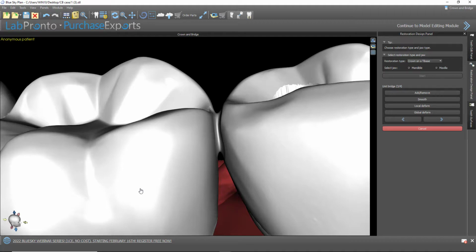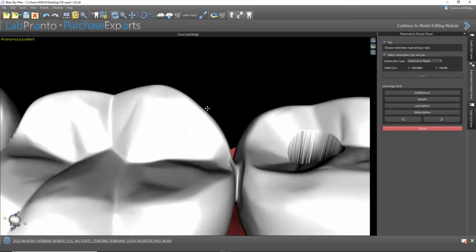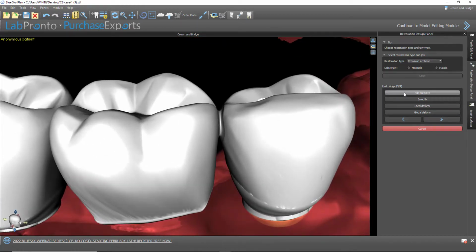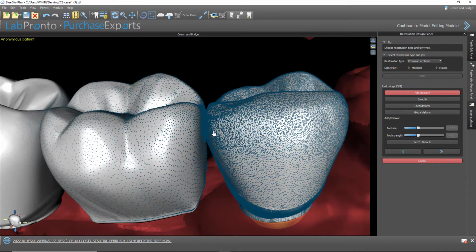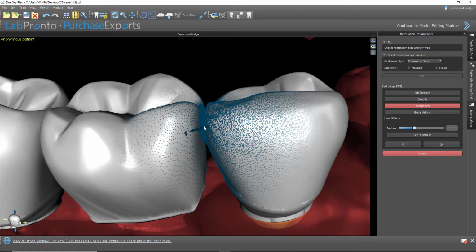And here's the connection. So it might have been better strategy to actually make the teeth that touch each other, but allows me now to demonstrate the functionality of designing that connection. Okay, so before we finalize the bridge, we could use our editing tools. So if I want to actually now at this point make modifications, I could go ahead and do that.